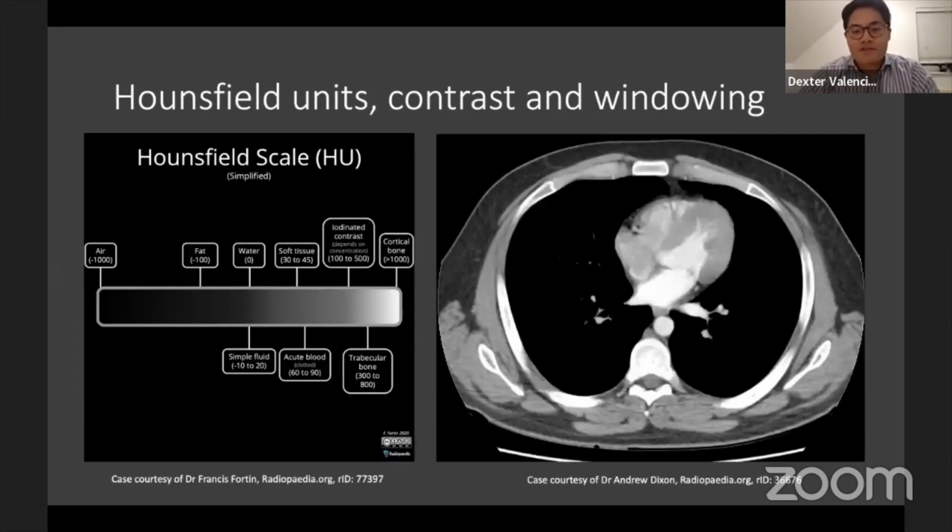So for any of you that have attended the previous studies, there may have been chat about how we interpret the grayscale of a CT scan. As you know, CT scans are multiple X-ray images that are put together, and it's based on a grayscale: black, grey and white.